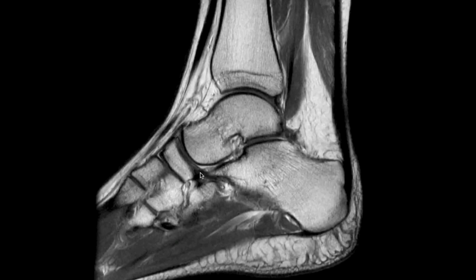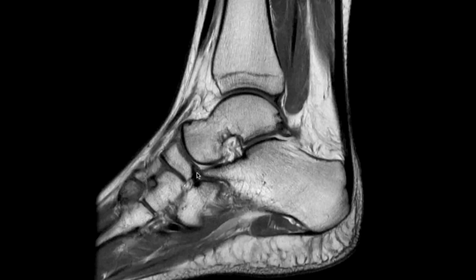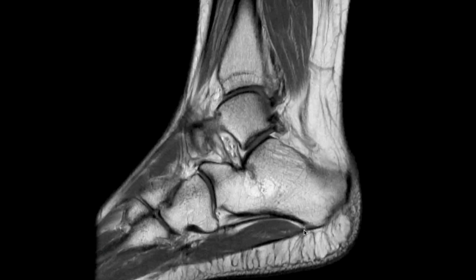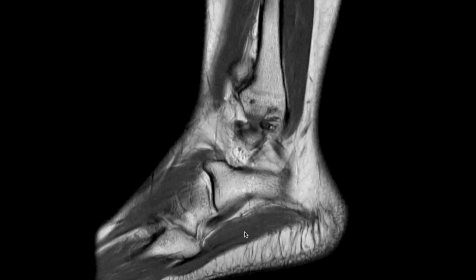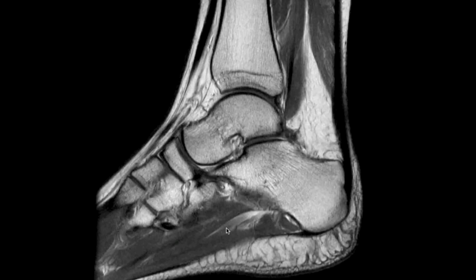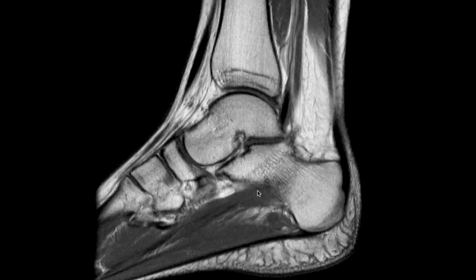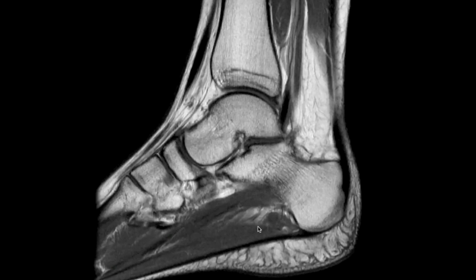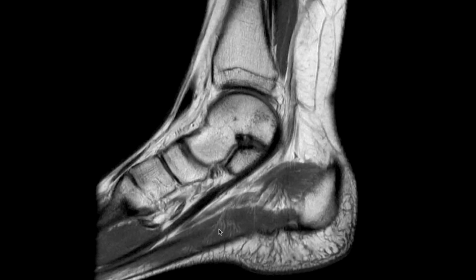And then just along the plantar aspect of the navicular, kind of holding that talar head in place, we see portions of our spring ligament complex here. The structure right there. And then finally, we can see our different cords of the plantar fascia. And then depending on which position we are, the lateral, the central, the medial cord, we can see either the abductor digiti minimi or quinti. We can see portions of the flexor digitorum brevis. We see portions of the quadratus plantae. And then finally, more medially, we can see portions of the abductor hallucis here.